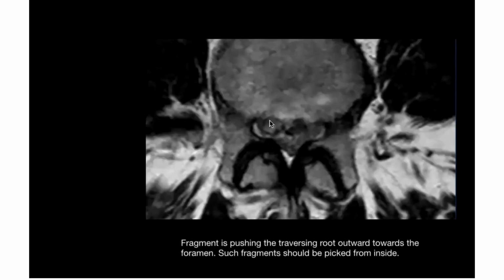Now you can see there's a herniation over here.